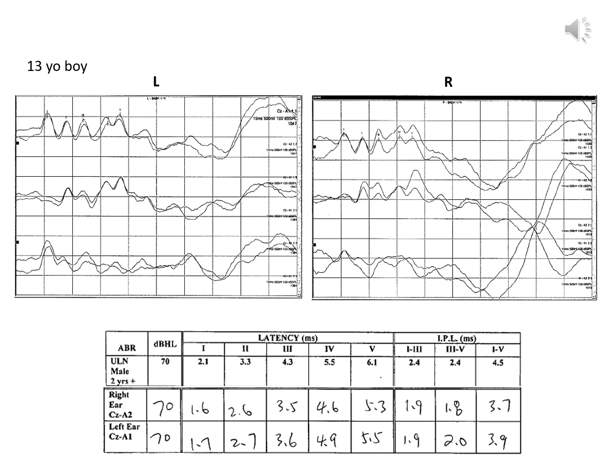So starting with the top, the ipsilateral tracings, you'll see there's a very beautiful 1, 2, 3, 4, 5 waveform morphology. And so this is quite lovely. Recall that only the 1, 3, 5s are obligatory, and so it's nice that we see the 2 and 4. And in this case, it's not labeled, but you can also see a 6 and a 7 in these waveforms.